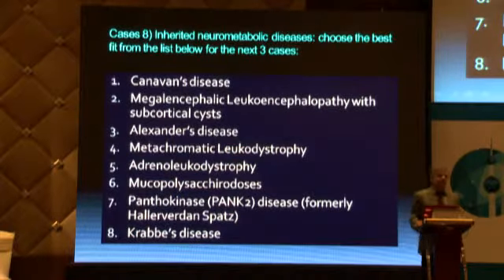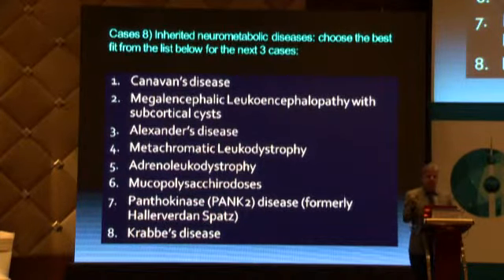Okay, now we get to a little more complicated situations. Look at all these diagnoses, memorize them, and I'll ask you questions, right? Very easy to do. I'm just kidding. So this is a list of the common metabolic diseases that we often see. I'll show you 3 cases and you try to match it to this list, okay?